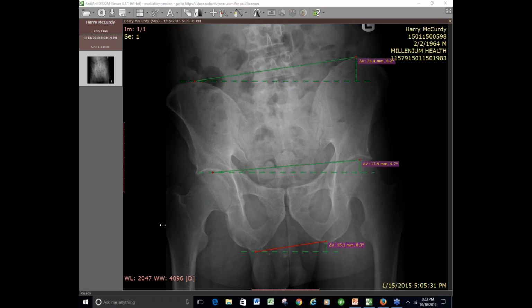Greg: So you're using the software to get the angle, so you don't have to plug in numbers? Right. Basically, so I don't have to do my Pythagorean theorem. I'm letting it do the calculations for me. Okay, got it. So look at this.